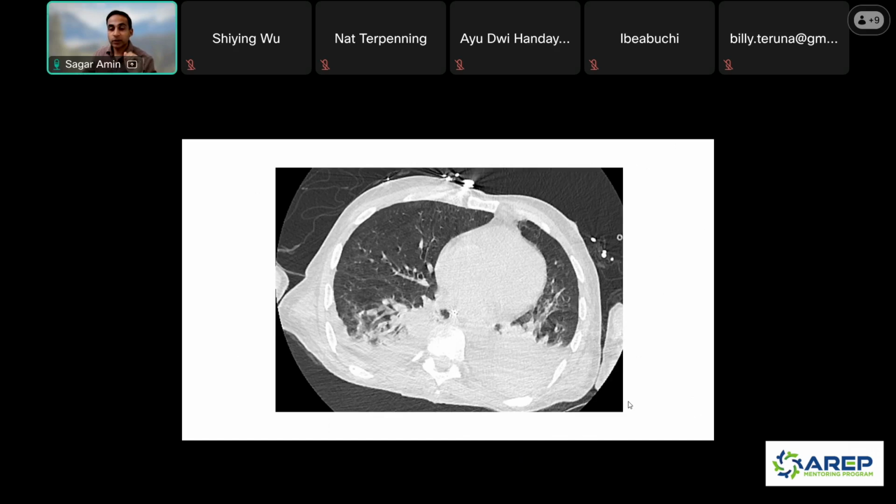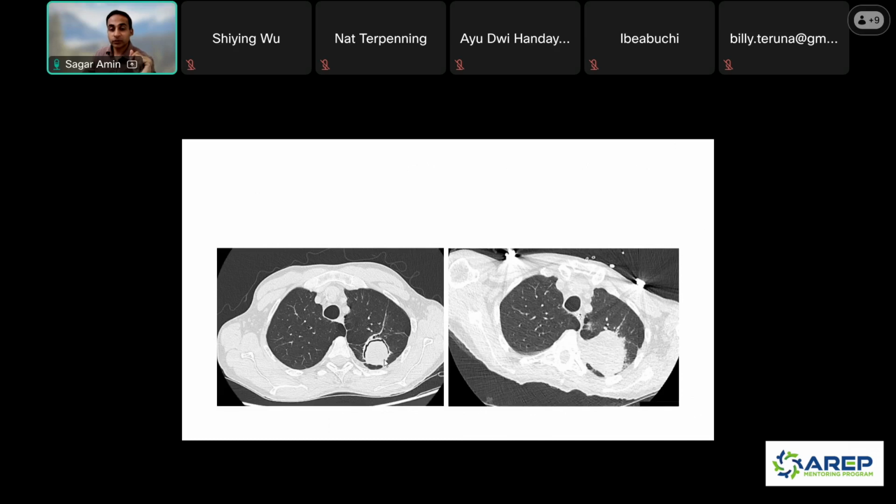And then in the lower lobes, there's all these opacities. You can see some aspiration. There's stuff in the airways, and then there's some dependent opacity. So they're aspirating something. And so here's the before and after. So we have the fungus ball in the cavitation, and then it developed into this.